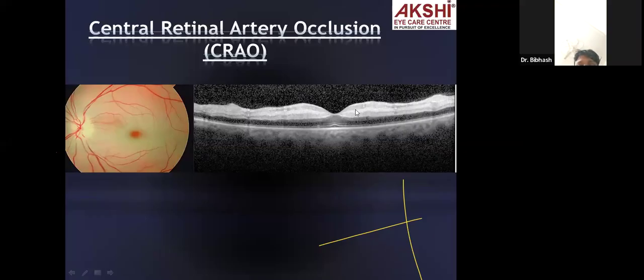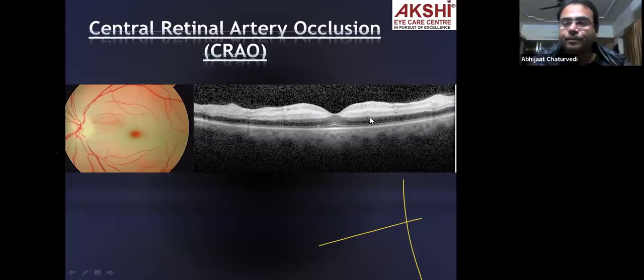Yeah. Perfect. So this is the sign of arterial occlusion. You can very well come across a combined occlusion as well. The arterial component has such an image, which is inner retinal hyperreflectivity. Not reflectivity, but hyperreflectivity. It glows, and this is a sign of arterial occlusion.